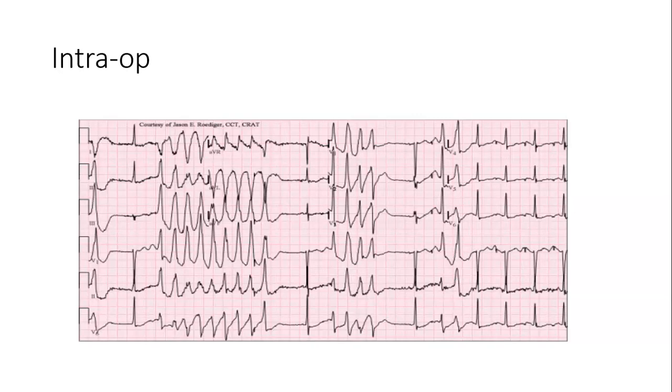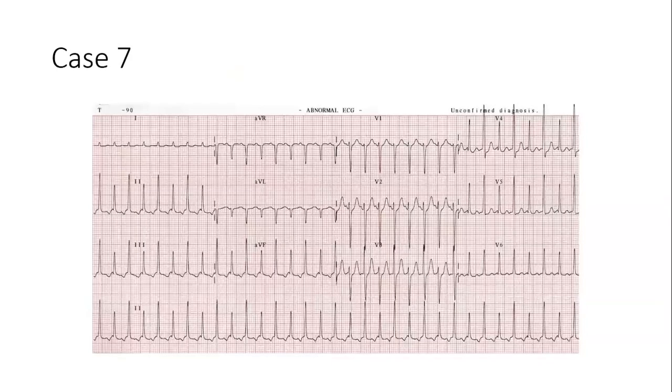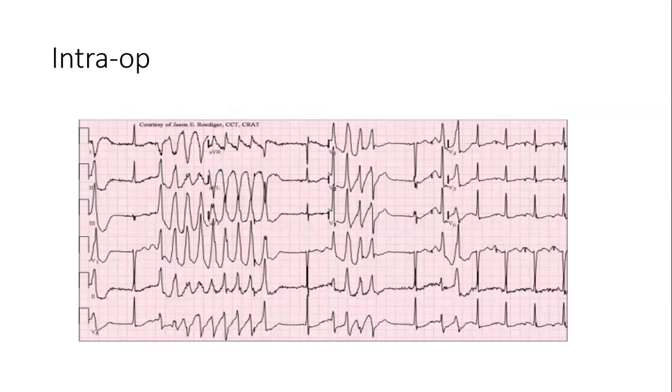Both of them. Polymorphic ventricular tachycardia, because it is polymorphic and it's a ventricular tachycardia, or torsades, both of them are correct. But torsades is very specific. To say torsades or polymorphic ventricular tachycardia, you'd get 4 marks for both, whichever answer you put for this one. But if you just say ventricular tachycardia, it won't necessarily be correct.